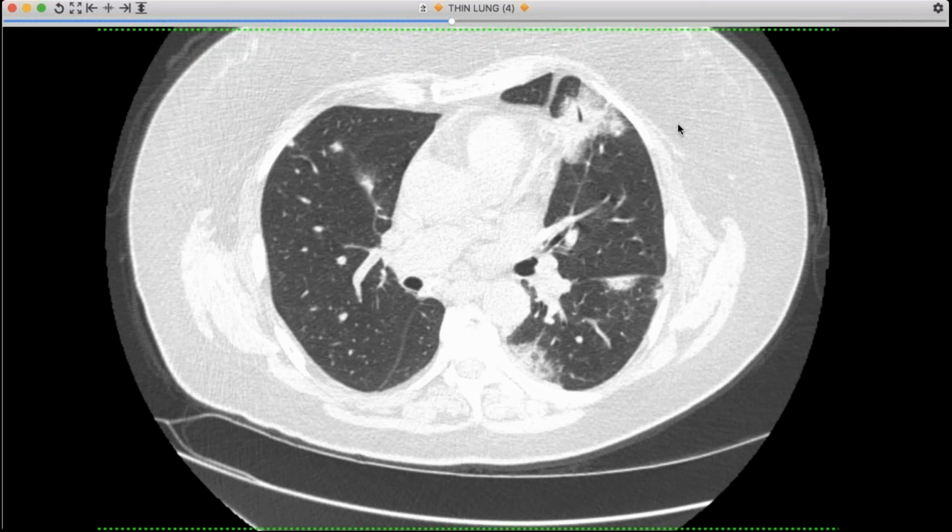Yeah. And the other interesting thing, and I've seen this a bunch now, is the reverse halo or atoll sign, whatever you want to call it, is clearly a sign indicating that the process is healing and resolving. But I still can't for the life of me figure out why this process cleans out from the center and not the periphery. You would think that lymphatic flow or drainage would be better along the periphery of an injury versus in the smack dab center of it. If anyone has any thoughts, I'd be interested to hear it.